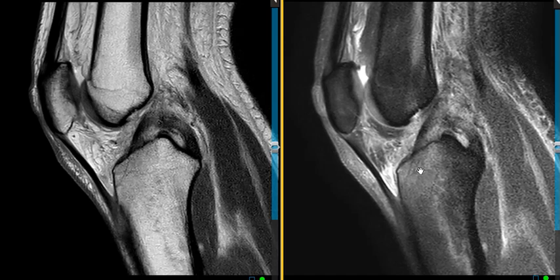impacted right here. So this is a case of a hyperextension injury with a high-grade impaction injury of the tibia, associated injury of Hoffa's fat pad, and these associated distractive force injuries of a ruptured PCL and posterior joint capsule tear. So a very common pattern, just glance up, hey, bone contusion here and edema, and injury back here. You might have had a hyperextension injury.